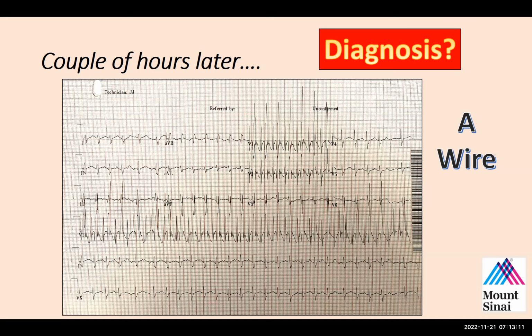Oh no, actually, I do see that there is 2-to-1 conduction, and then there's 1-to-1 and then 2-to-1 conduction at some point. Well, it may be that some of these are just blocked. Or maybe that they're buried in the V's, right?